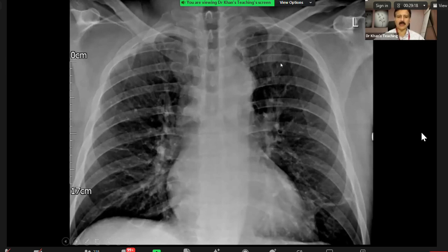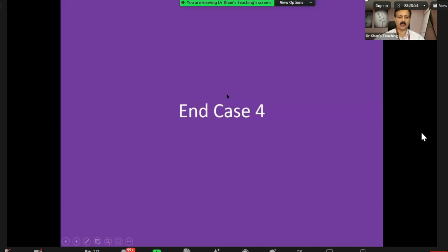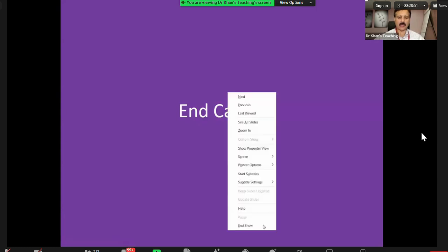Luckily, the patient did not suffer, because after 2 weeks, the scanning picked it up. But having said that, this is a nodule, and this per se is a FRCR case. It can come in the viva, it can come in the rapid reporting. And this is a CT to make the point. Okay, thank you, candidate 1, and I'm going to candidate 2 now.